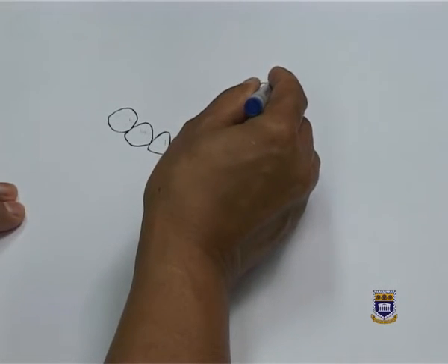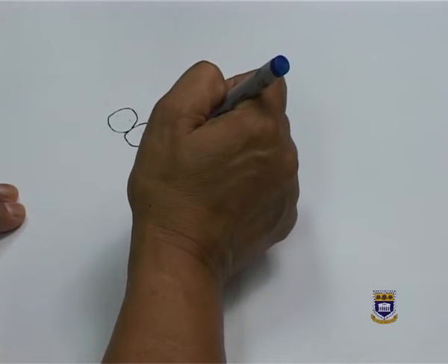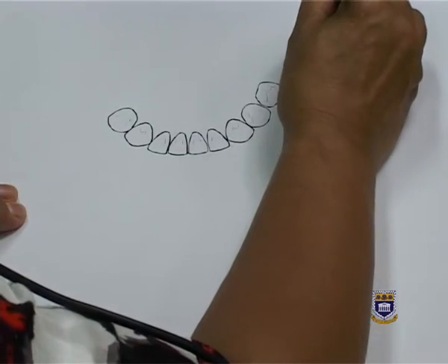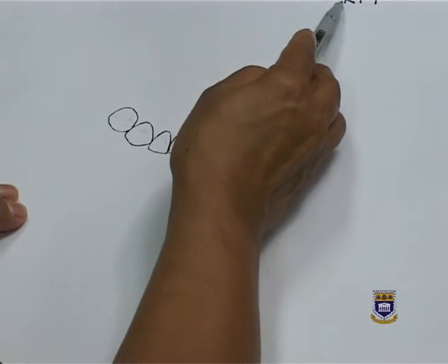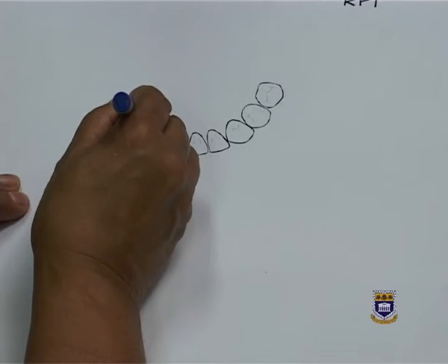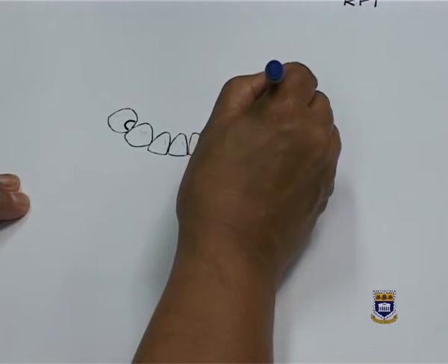So I'm deciding to use a lingual bar because I've got my 7 millimeters. I have to provide support, and because it's an RPI system, which stands for a mesial rest, a proximal plate, and a gingivally approaching I-bar, I'm going to provide a mesial rest on a premolar.